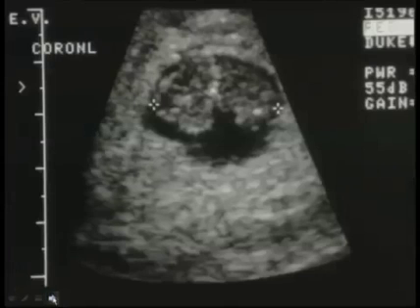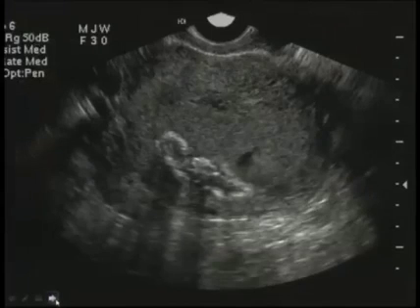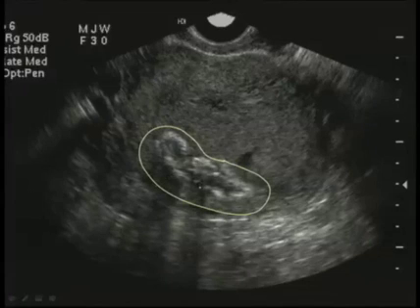Here's another example of embryonic death, and this is a good example of the so-called first trimester oligohydramnios. You see that the embryo virtually fills the entire gestational sac here, and there's very little fluid in this area relative to the size of the embryo. Here's another case of embryonic death, or in this case missed abortion, which is the same thing. You can see here's the embryo right here. In this case, this is farther along. You can see most of the bones are ossified, but they are now collapsed in on themselves. There's very little fluid around the embryo, and the fetus has become more macerated and is starting to resorb.